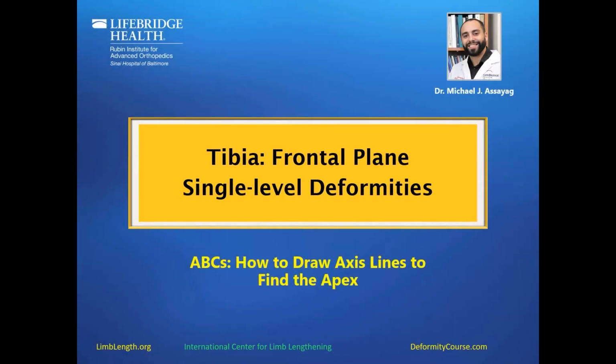Now that we know how to identify the mechanical axis of the lower extremities, analyze the deformity, and pick the bone to correct, it is time to learn how to draw the axis lines that will help you find the apex of the deformities.